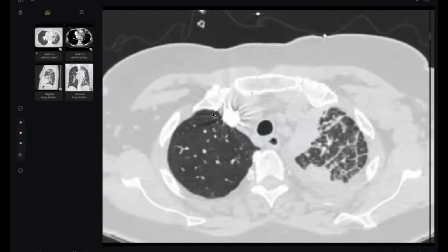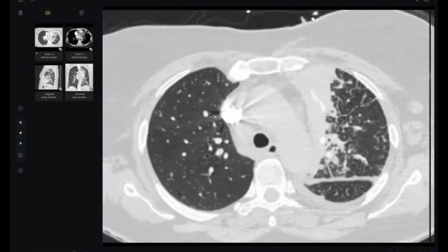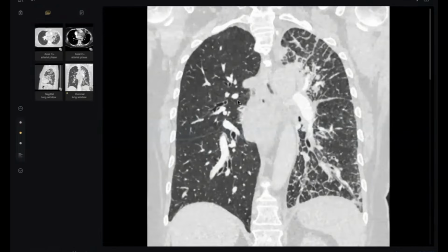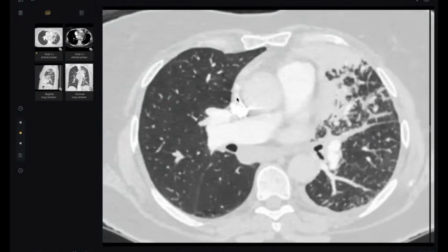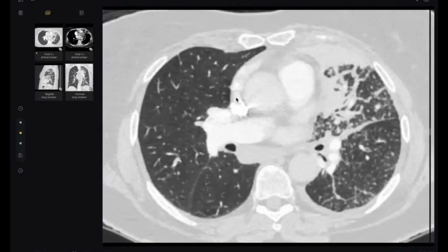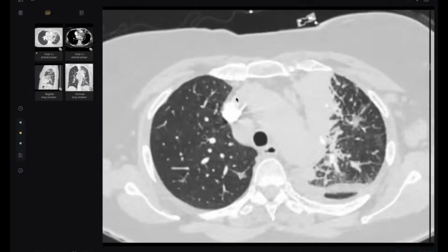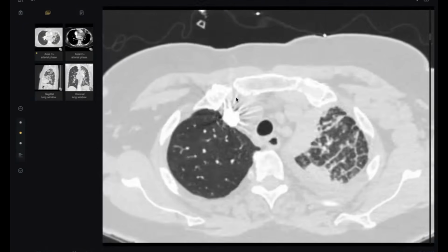Okay, look at the CT. What happened here? This is lymphangitic carcinomatosis. Yes. Why? Reticular shadowing, there are infiltrates and there is reticulation. These likely represent lymphangitic carcinomatosis, not just reticular nodular. And what about the distribution? Where exactly? They're mostly in the central area.